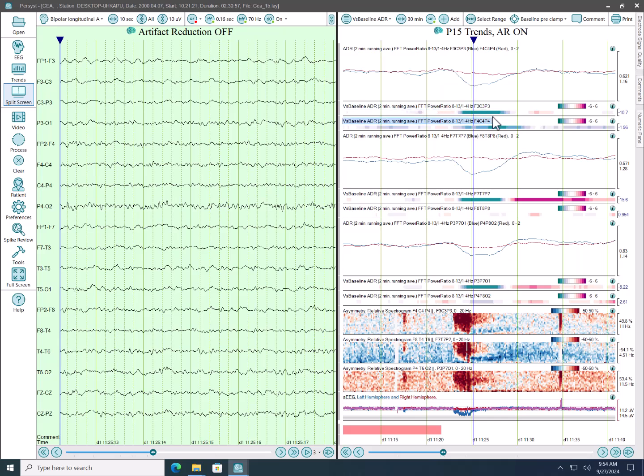But we can also calculate z-scores. And so when we compare it to this baseline, which, for another clinical application, that baseline could have been the day before, or 2 days before, or 2 hours before. It depends on where you set those baselines. There'll always be an automatic one set at the beginning of the recording, but you may set your own as well. Roughly 5 minutes is a decent minimum to give you enough samples to calculate that empirical null. Longer is okay. Generally, you don't want to span big state changes because that'll be incorporated into the null for those z-scores to be calculated.